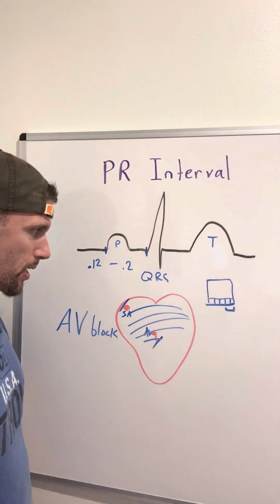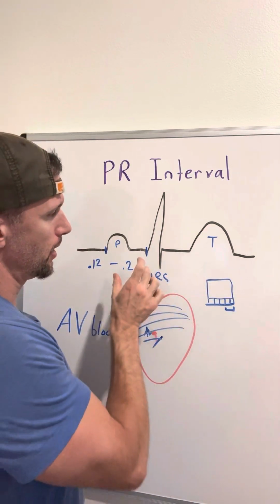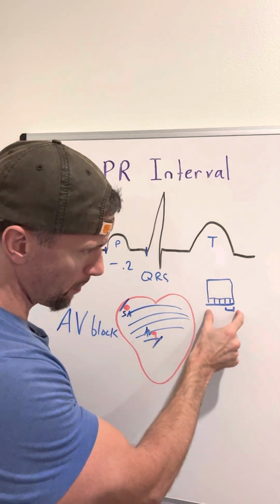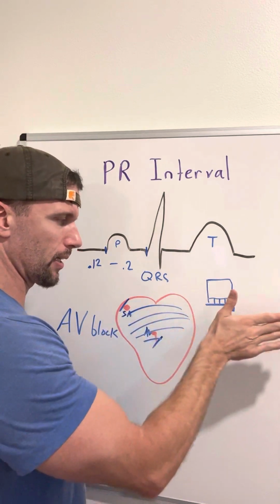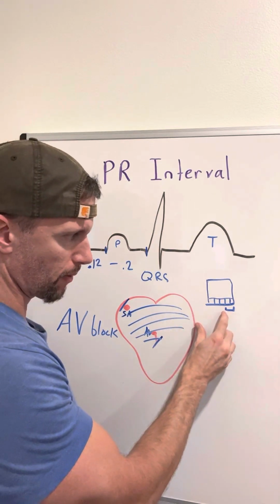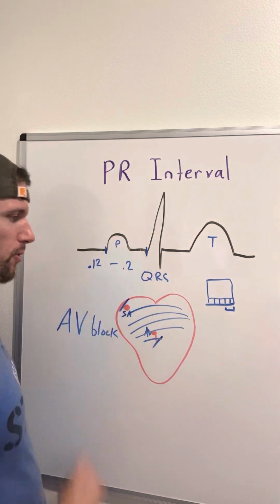And what does that represent? Well, you know how on the ECG, time is represented as it slides by. This should all fall within 3 to 5 little boxes, or just one big box. So over here, here's one big box. It actually has 25 little boxes in it, but we're just looking at it lengthwise. So that's the 5 little boxes within the big box. It should be between 3 and 5. So that represents 0.12 to 0.2 seconds. So that's what you want to see in this little interval here.